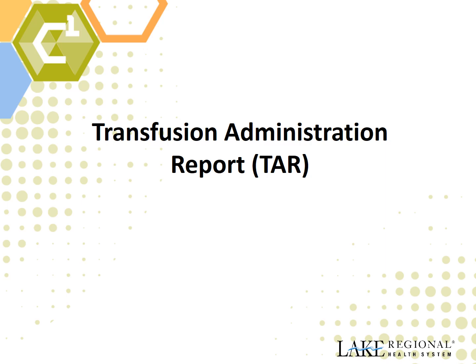Blood consent will still be obtained on paper, and this consent is good for the length of the hospital visit unless the provider requests another consent is obtained. Setup and infusing of the products remains the same. This is focusing on the Meditech piece. The only exception to TAR is MTP, Massive Transfusion Protocol, and the CVOR, in which the current processes remain unchanged.